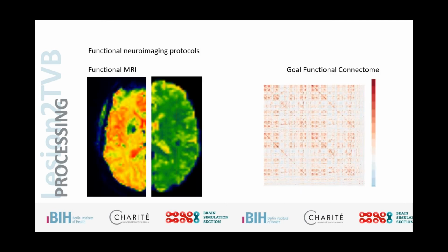In a similar way, we go for our fMRI data, where we start again with the raw image data suffering from a lot of those drawbacks that I mentioned. For example, we can clearly see a distortion here, which is introduced in the frontal cortex, just by the direction of the acquisition. You can imagine it going pretty much from front to back, applying the magnetic field to our data, and then we have a lot of distortion here in the beginning, and we're trying to mathematically correct for these so that we end up with a nice representation of the whole brain for our fMRI data, and normalize so that we can see we're actually having this higher activity along the cortex rather than in the white matter that we have here in the raw image.